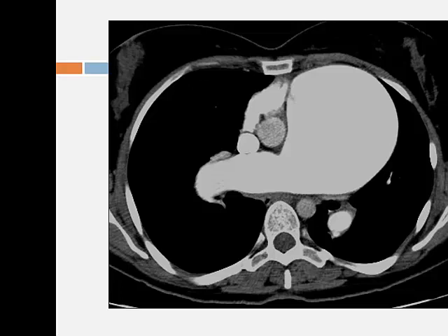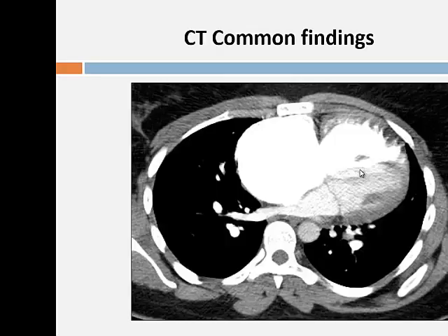The other thing is, as the pulmonary arteries get very big, they can often calcify. If you think about it, you see calcification in the aorta all the time. You'll never see calcification in the pulmonary arteries unless they're abnormal for whatever reason. And as the pulmonary arteries get big, not only do they calcify, they can also form thrombus in situ. So just because you see laminar thrombus in a pulmonary artery, it doesn't necessarily mean that is the cause of the pulmonary hypertension. Rather, it can be thrombus in situ. The key is often it's associated with calcification as well. That's just a phenomenon of poor flow around the pulmonary arteries rather than the other way around. So it's, again, another potential catch.